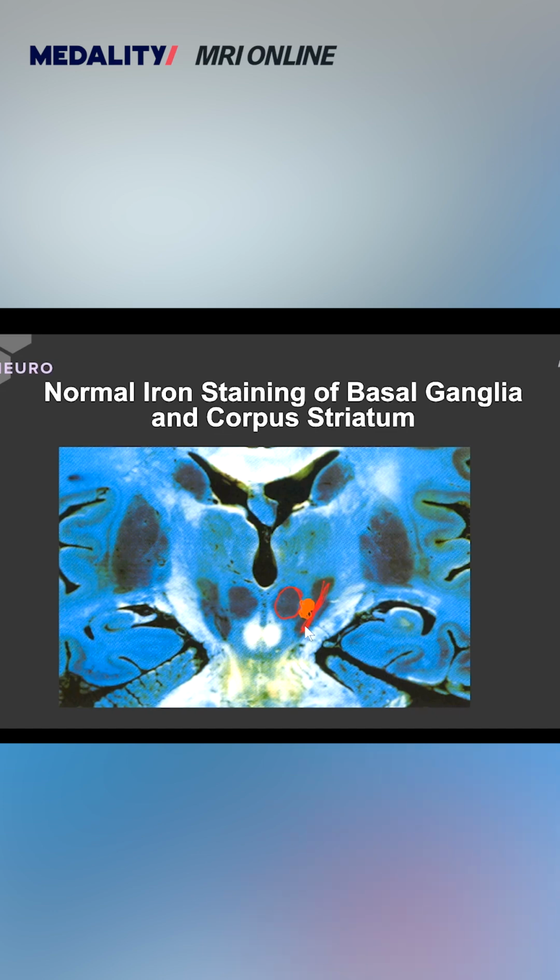We'll also talk about the medial lateral extent of accumulation of iron in the nigrostriatal distribution in the axial projection in the next vignette.